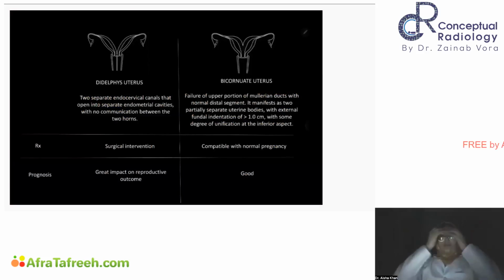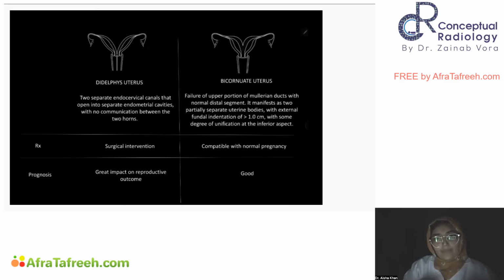Now, we can have a doubt here, na? If it is didelphys versus bicornuate bicollis. So I told you any day in didelphys the two hemiuteri will be much more divergent. Similarly, they will not show any communication with each other at any point of time, anywhere. No communication, widely separate cavities, divergent cavities.